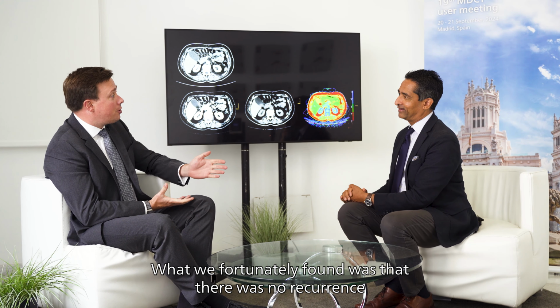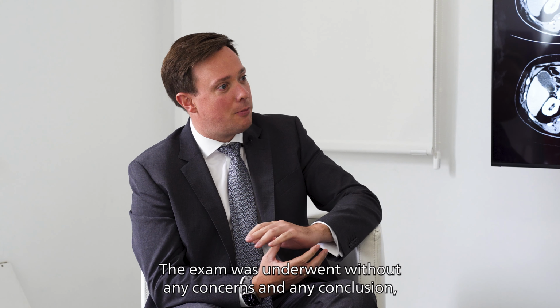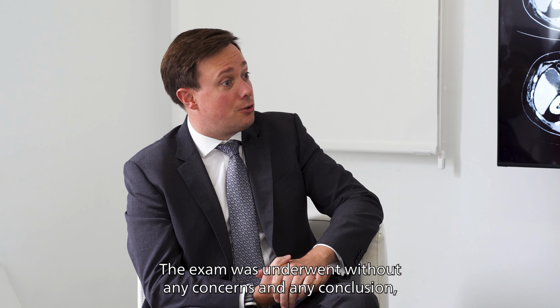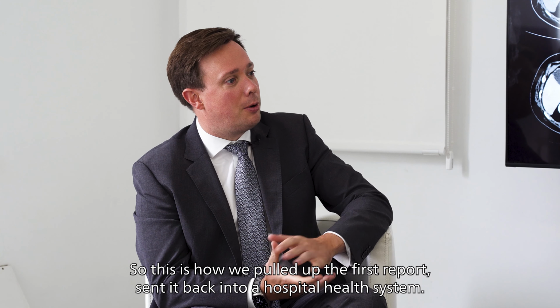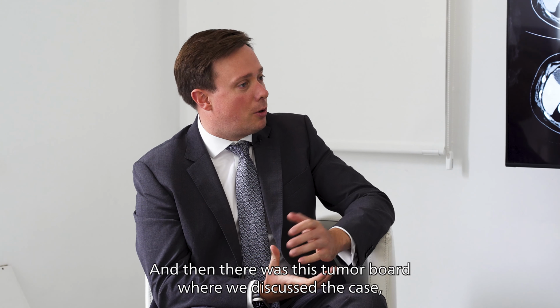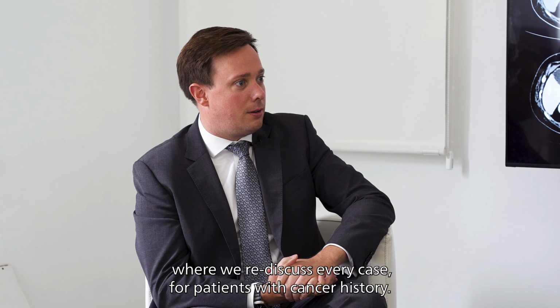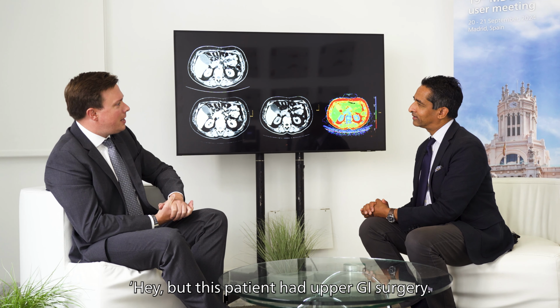So what we fortunately found was that there was no recurrence of metastatic disease, no local recurrence. The exam ended without any concerns and any bad conclusion or relevant conclusion. So this is how we pulled up the first report, sent it back into our hospital health system. And then there was this tumor board where we rediscussed every case for patients with cancer history. And what was found there was that they mentioned, hey, but this patient, he had upper GI.